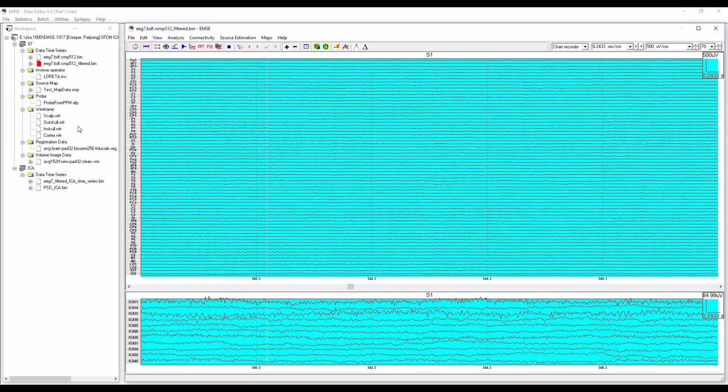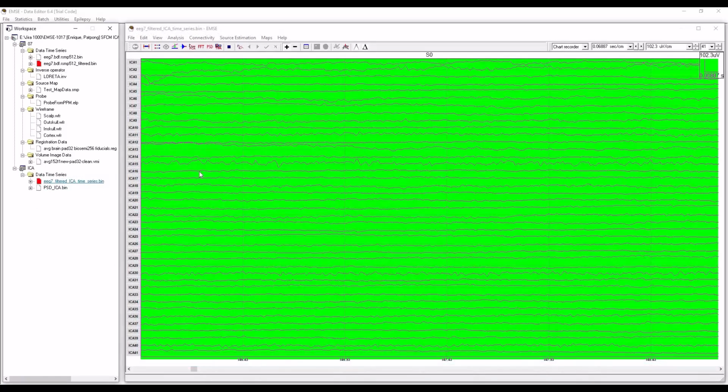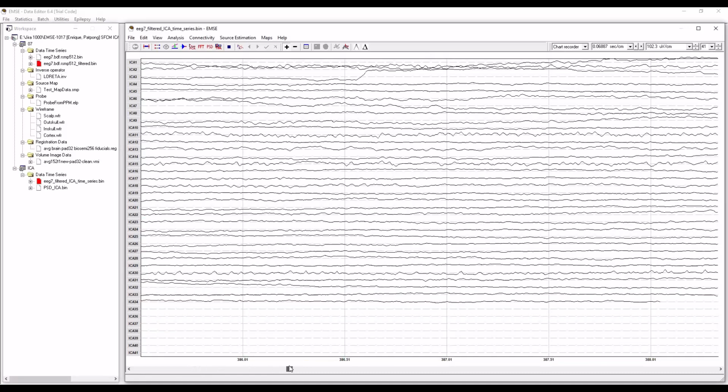I saved them to a new time series down here, and I called it a new project, because now, in a sense, we're no longer using these channel names. I'll show you what it is. So when I saved all of the ICA components, which, by the way, I'd selected 41 of them based on the 99% criterion, this is what I got. Now all the channels are labeled ICA 1 through ICA 41, but as you'll see, this covers the same time span, and we still have these same event segments marked.